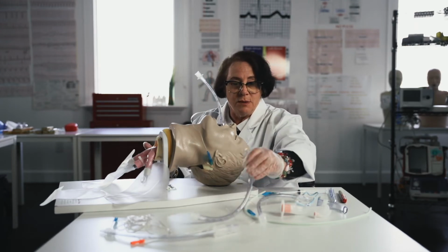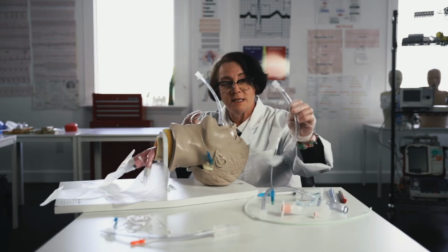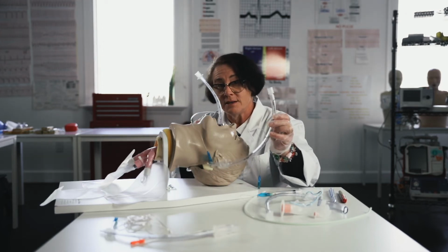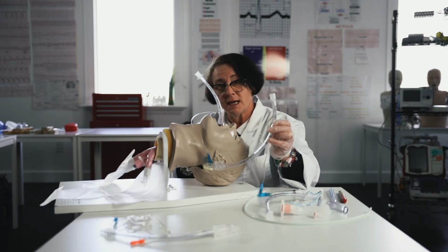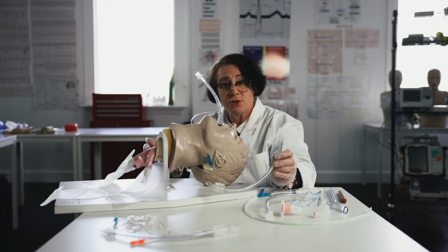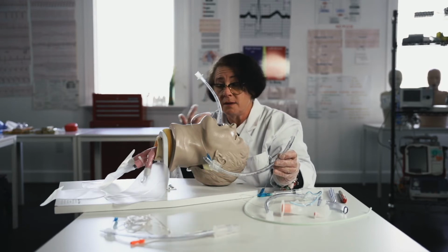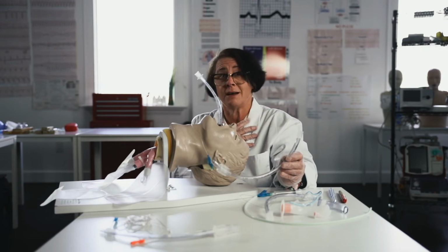Adult females intubated with a 7.0, it's usually 21 at the lip. 8.0, it's usually 24 at the lip. It's roughly 3 times the size of the endotracheal tube. Now, it's not an exact science, but we won't vary much as humans from 2 centimeters above our carina and our lip, unless we have a wonderfully long neck or no neck.